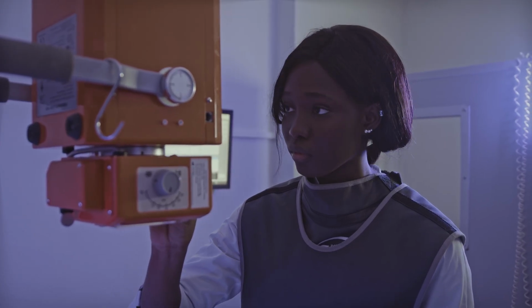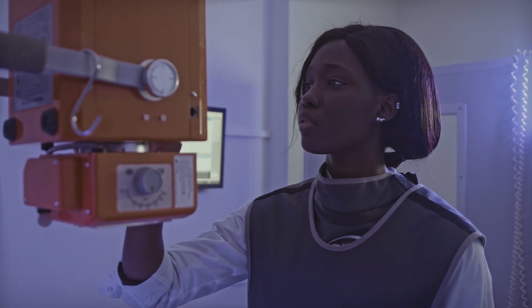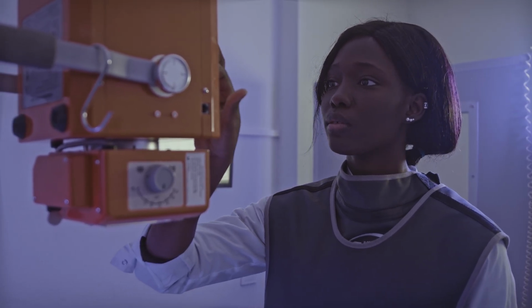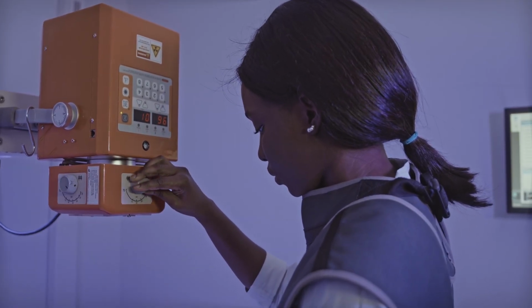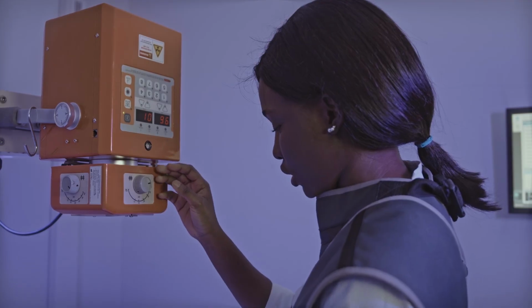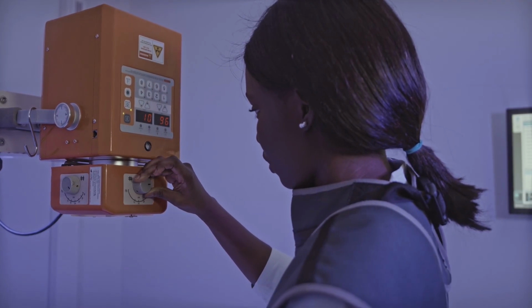The goal of this video is first to form a general picture in your mind, to understand what parts a radiology machine is made of, what role each section plays, and how these components together create a complete imaging system. This video is actually our roadmap for continuing this playlist.